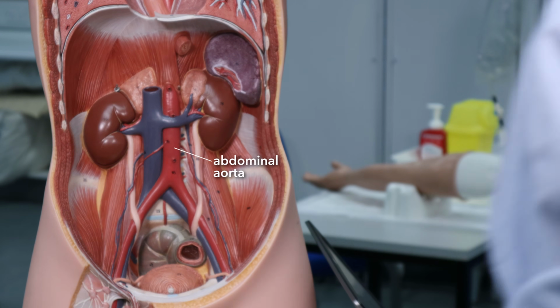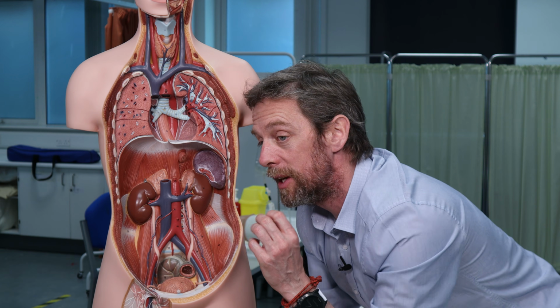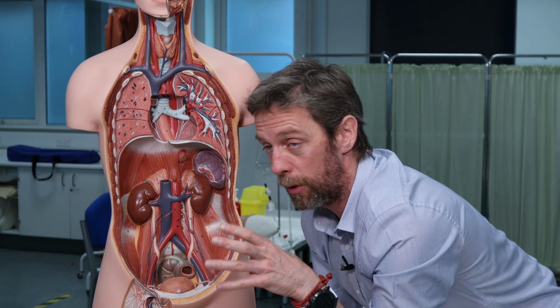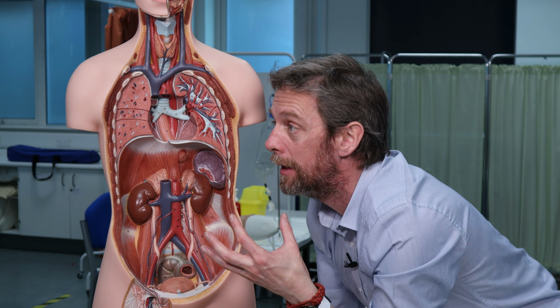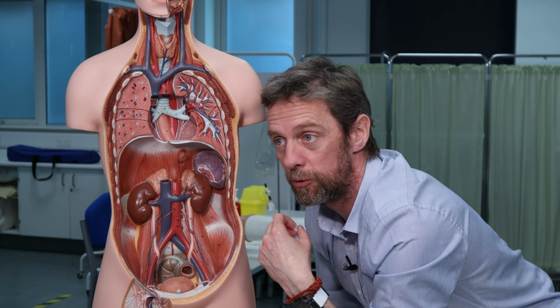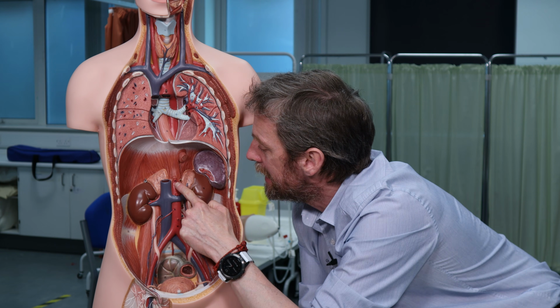Now, if we look at these big blood vessels and we follow them up and down as we scroll up and down, we can look for branches. And if we follow those branches to see where they go, we'll probably find many of the organs, all right? And then we'll try and work out what the other stuff is that we haven't found. Anyway, so here's the aorta.